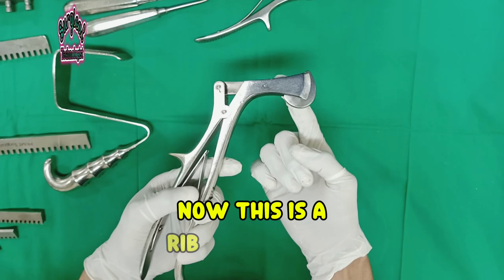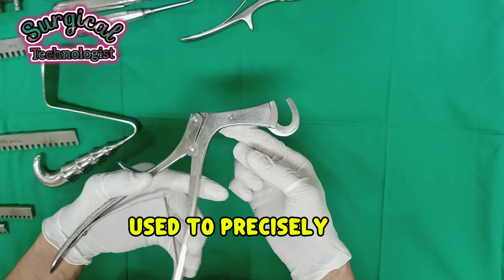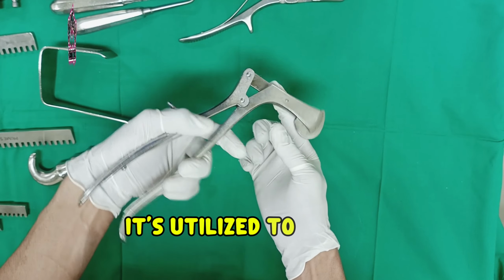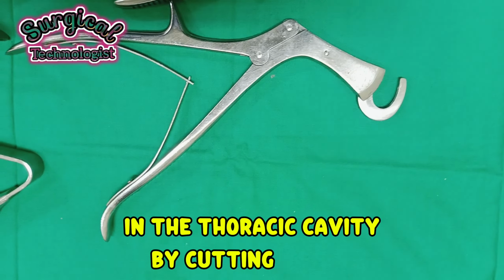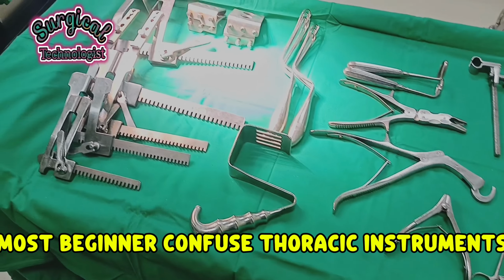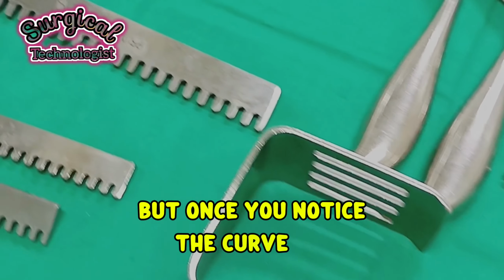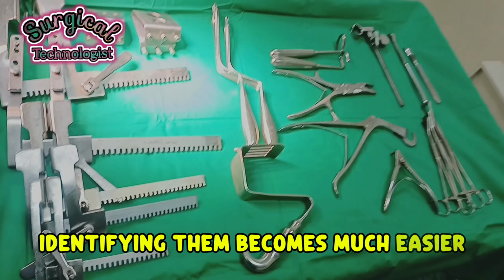Now, this is a rib cutter, also known as a rib shear, used to precisely cut the rib. It's utilized to create a window in the thoracic cavity, if required, by cutting the rib. Most beginners confuse thoracic instruments, but once you notice the curve and tip design, identifying them becomes much easier.